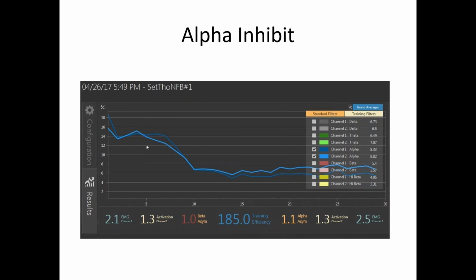So if you watch somebody who's doing QEEG, you'll see periodic moments of alpha. In a healthy person, they'll take an alpha break every couple of seconds, depending on how much they're processing. And the whole brain will suddenly go into alpha and then move out. And we call that synchronization and desynchronization. So you want to see it synchronize into alpha, then desynchronize into activity, synchronize into alpha, desynchronize into activity. That is the thalamocortical loops conducting the brain symphony, telling, okay, you guys get out and play, you guys sit on the bench, you guys over there deliver sodas, you guys take care of the people, you guys applaud. It's directing the game. And so you see the brain shifting constantly. And those are called phase transitions. That's a fancy word for it. Oh, they're going through phase transitions.